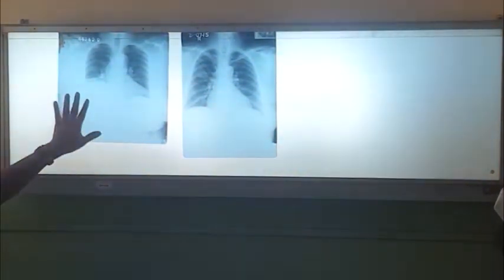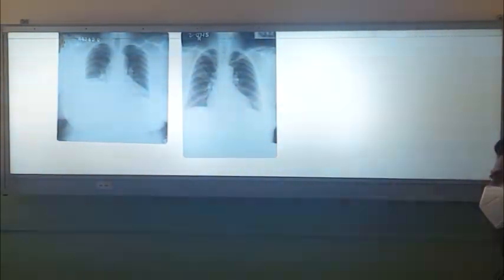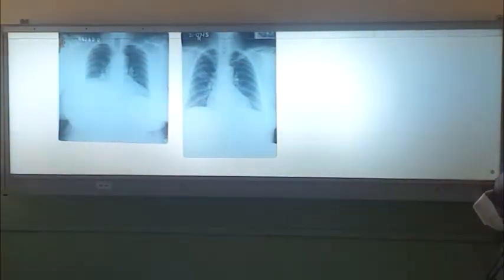So this is a patient with diaphragmatic paralysis. You can do ultrasound or fluoroscopy and see the movements of the hemidiaphragm, right? If it is paralyzed, there will be paradoxical movements. During inspiration, your diaphragm goes down with the contraction. But here, it will go up when you try to inspire. So all paradoxical movements. This is a paralyzed hemidiaphragm. When there is a paralyzed hemidiaphragm, you can see some atelectasis also. Sometimes you can get basal pneumonia also, right?